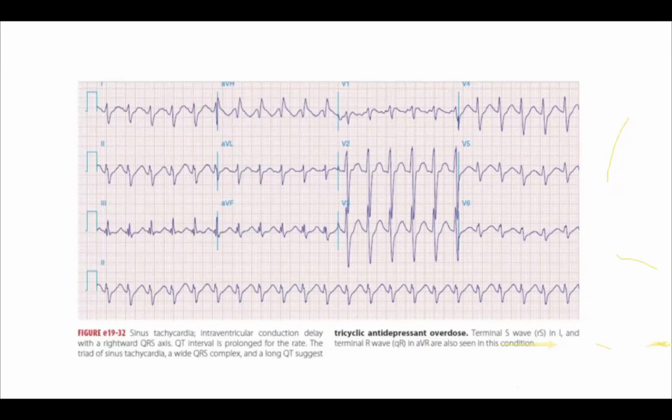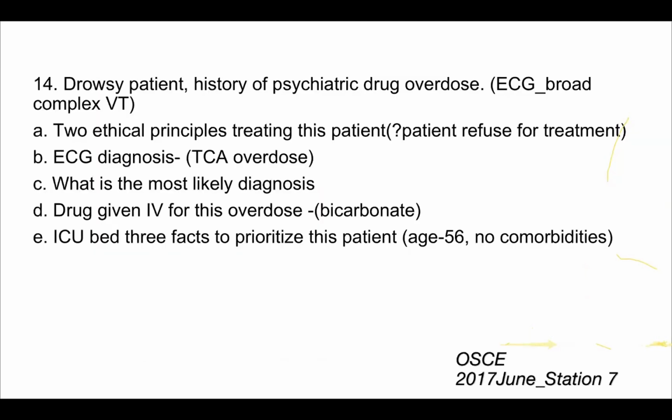This is something they have given, and clinically we might not see these things this much, but get into your heads that you always have to think about the short history they are giving. Then only you can think what this can be, right? Remember, this is something they have given previously. With these sorts of things, they can develop a whole question like this. This is from the 2017 OSCE.